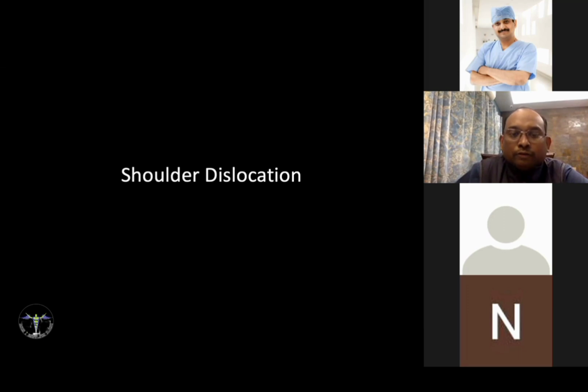When we talk of glenoid abnormality, we are talking of either a Bankart lesion, where there is only the labral tear, or there is also a bony defect in it. When we are talking of the humeral head, then something called a Hill-Sachs lesion is there, where there is a bony defect in the posterior superior aspect of the humeral head.